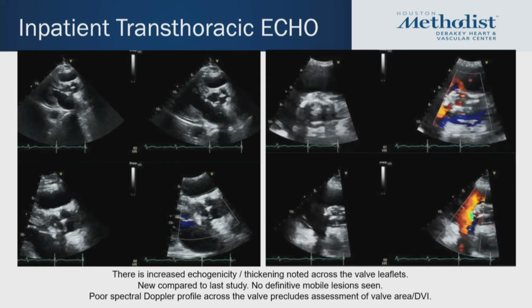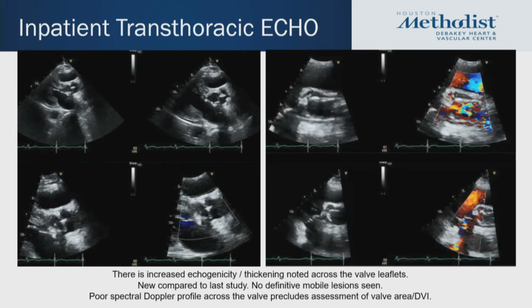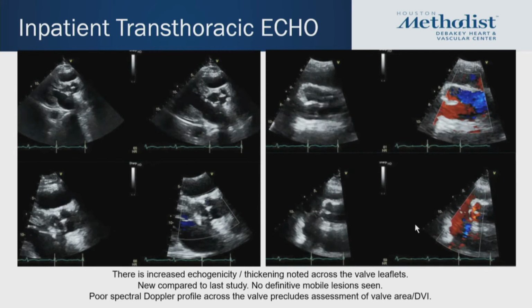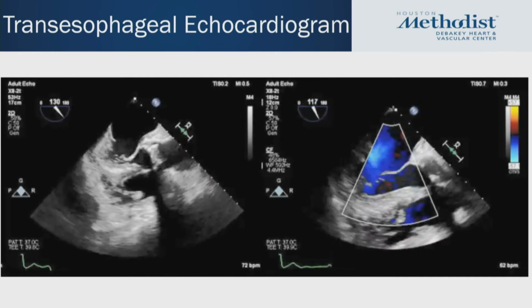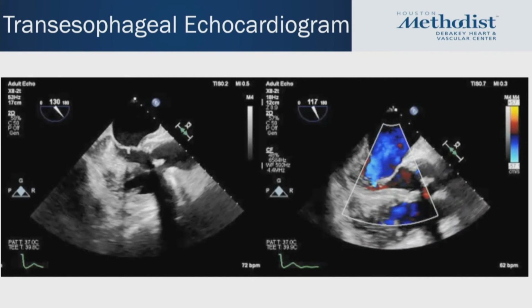So a transesophageal echocardiogram was recommended. His transesophageal echocardiogram here shows that the bioprosthesis is significantly thickened.